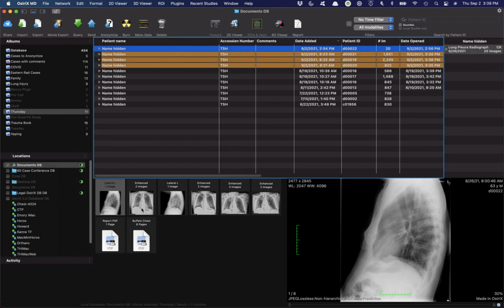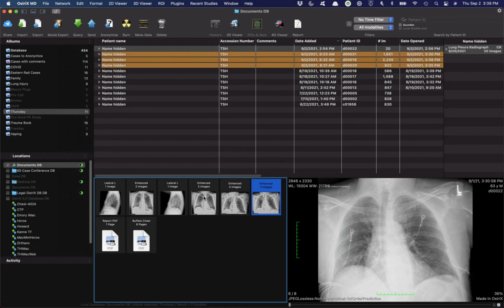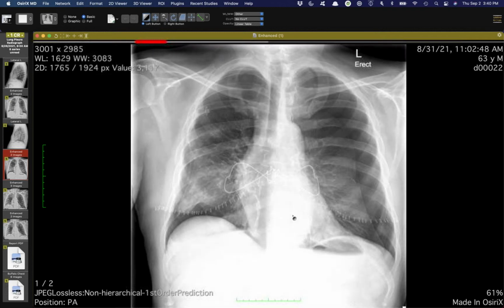This is a quick one that we saw this week, and it's a fun one though. This is a patient that underwent a lung transplant about a month ago, so late July, for emphysema. You can see he still has the skin staples from their clamshell sternotomy. Had a bronch after this radiograph, and then the next day was in rehab and was developing chest pain and just generalized discomfort and shortness of breath.